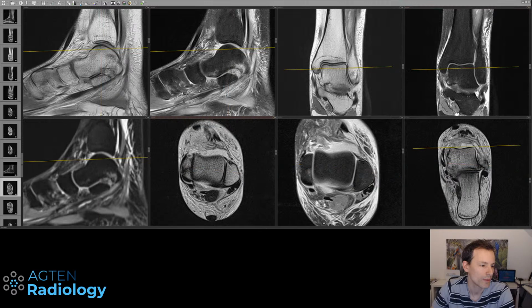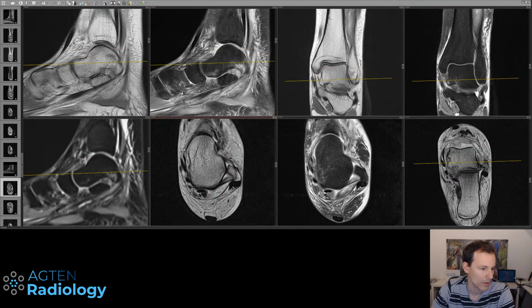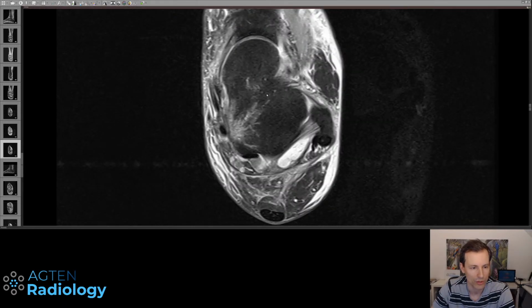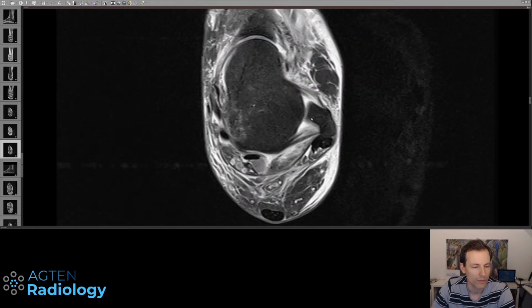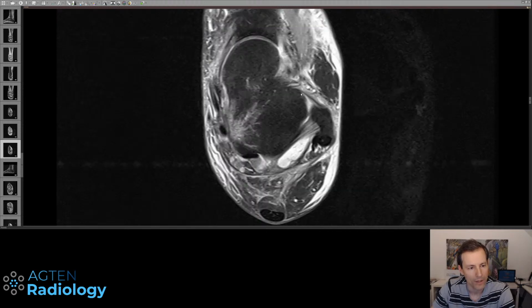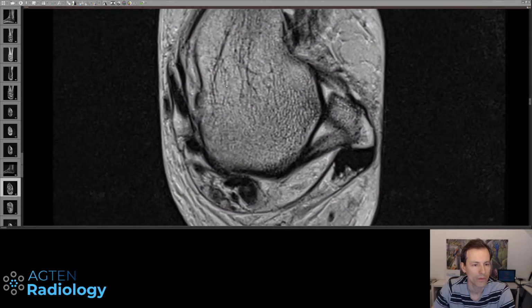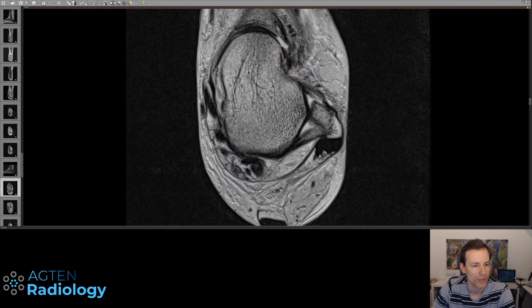Then moving on to the lateral ligaments. So we can maybe start with any kind of transverse section, which is basically fine, and always start off with the ATFL. And you can see here there are at least some fibers going through, right? Then here it's a little bit less clear. We have this kind of ligament here, which I would say is maybe a little bit better appreciated here. And in all, it's too thick, right? So it's not like a normal ligament.